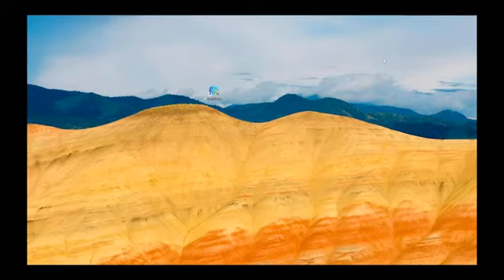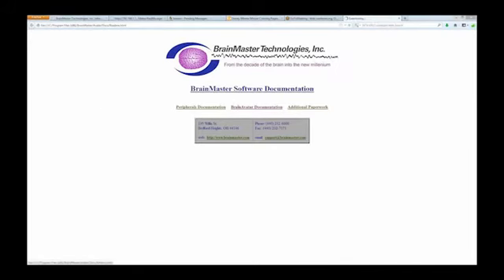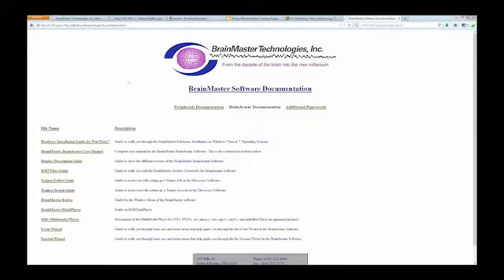Now, one of the things I do want to cover right off the bat is some different resources that you have available, other than, of course, this webinar right here. The first one I'm going to show you is by opening up our BrainAvatar software. When we are in the BrainAvatar software, we're going to click our product manuals and go to BrainAvatar documentation. This has a lot of information on many of the things I am covering. I'm going to be covering things that are brought to you in the Event Wizard, as well as some of the things that are in the main BrainAvatar user manual.